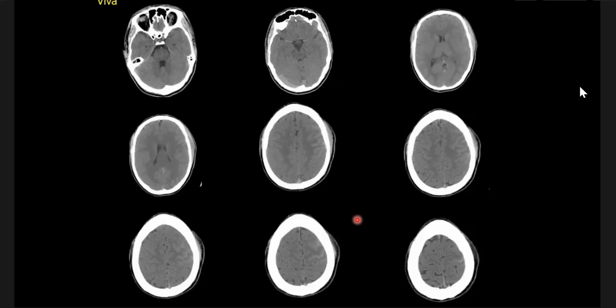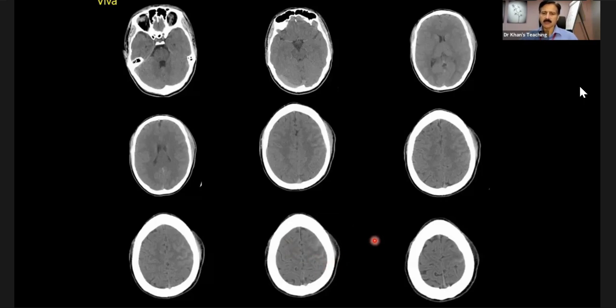Yeah, there could be calcification, gyral calcification, gyral fold calcification. Look at the density. It's not that high. Yeah, you're right. Calcification will always be more than 80 Hounsfield units. If you see, this is something like the gray matter. It looks more like hemorrhage to me. Most likely. What else can it be? How are you going to tackle it in the exam? That's the basic question.